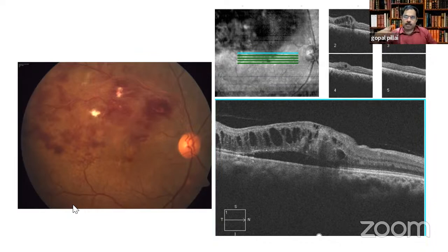Okay, again, a significantly ischemic retinal vein occlusion will have more inner hyperreflectivity. Like a central retinal artery occlusion or a branch retinal artery occlusion will have very thick hyperreflective inner retina, and it will cause a lot of shadowing. It will not be that much hyperreflective, but the more ischemia there is, the more hyperreflectivity will be there in the inner retina.